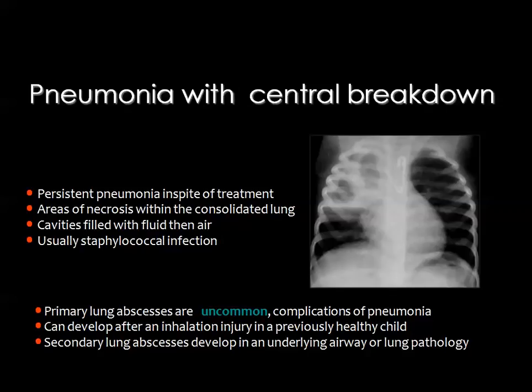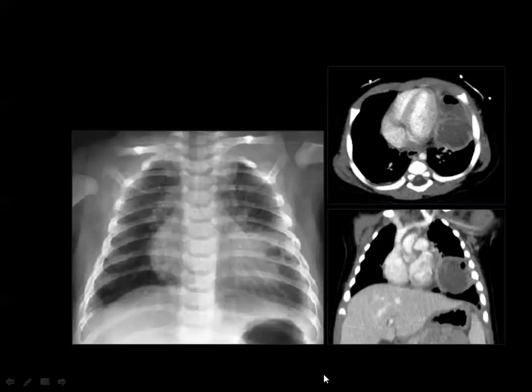This may result from persistence of the infection and poor response to medical treatment, resulting in the development of cavities within the pneumonia or the area of pneumonic consolidation, and this is commonly seen in cases of staphylococcal pneumonia. Of course, you see here a foreign body which has been aspirated, and it may obstruct the trachea or the bronchus, resulting in this unresolving inflammatory process.